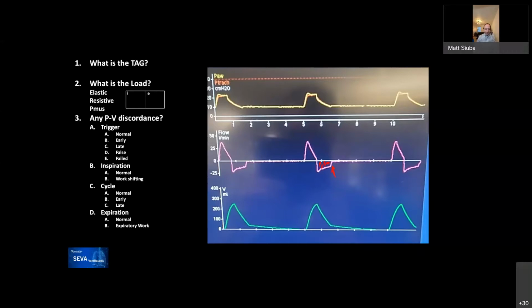And the other thing that we notice, and yes, I agree, otherwise this patient looks pretty darn passive. The other thing is this part of the waveform here, compared to what it might look like and what it does look like. It would be hard to explain with human physiology for the ventilator to see the pressure waveform decrement in this way. Unlike the one I showed from my case, this one snaps back all of a sudden and then returns to normal. So does that give you any hints about what might be going on here?